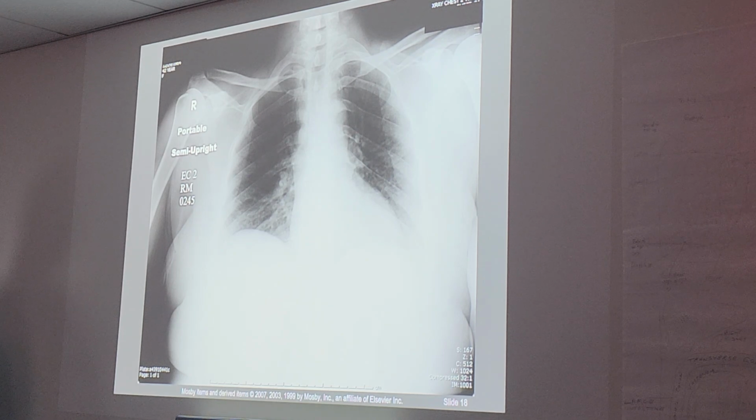Sure. Okay, go ahead. Tell me why. Because they have the abdomen in it too. They have the abdomen where? On the X-ray. It's too much on the right side. If you look at the center, it's like T8, T9. Too much on the left, yeah, but it's open.